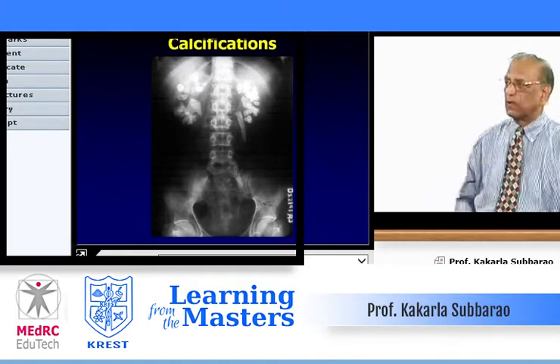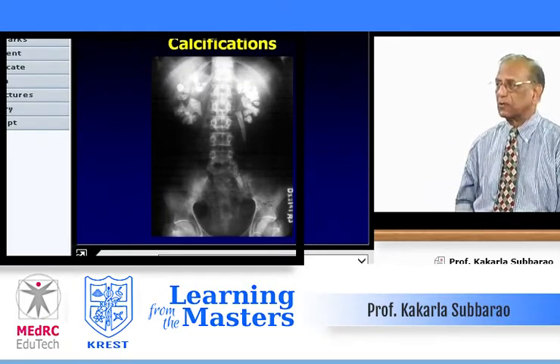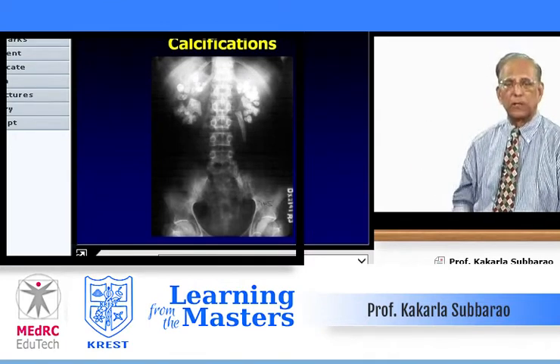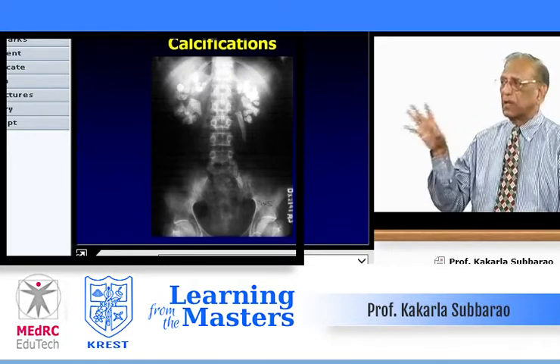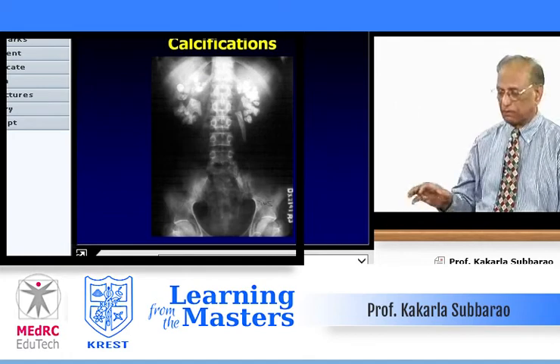This, of course, shows extensive calcifications of both kidneys and also the left ureter. Often it occurs due to tuberculosis. Although classical tuberculosis of the kidney is putty kidney, here there are parenchymal calcifications because of pyonephrosis, stasis, infection, and multiple calculi, including in the left ureter.